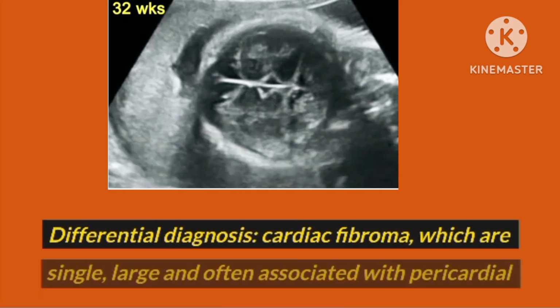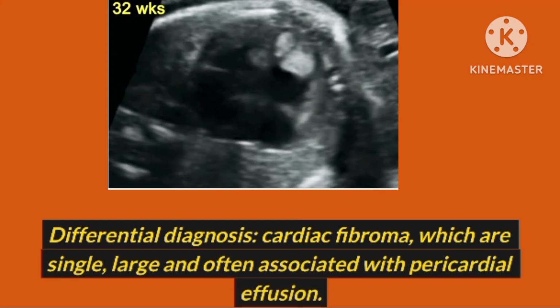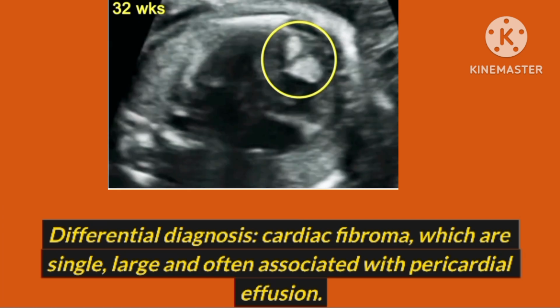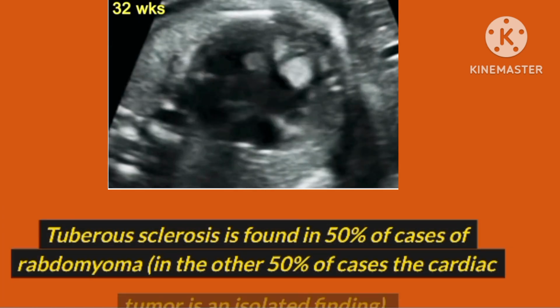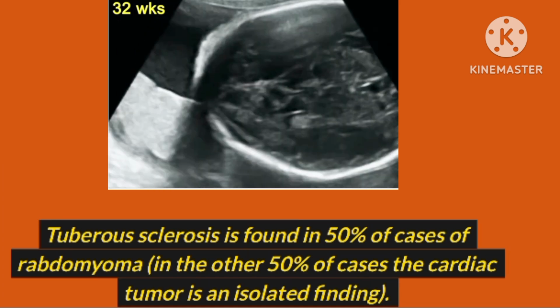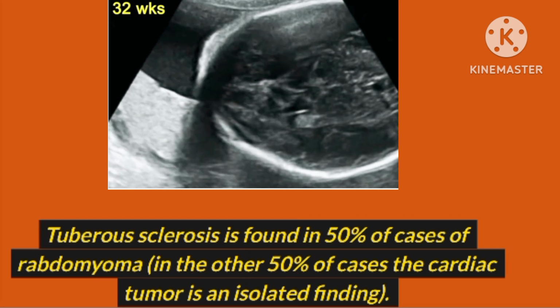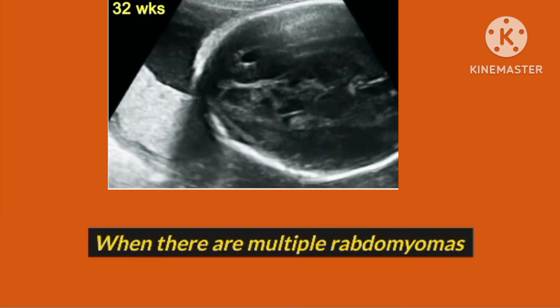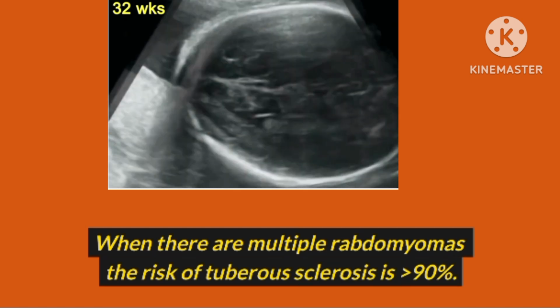Differential diagnosis, cardiac fibroma, which are single, large, and often associated with pericardial effusion. Tuberous sclerosis is found in 50% of cases of rhabdomyoma. In the other 50% of cases, the cardiac tumor is an isolated finding. When there are multiple rhabdomyomas, the risk of tuberous sclerosis is greater than 90%.